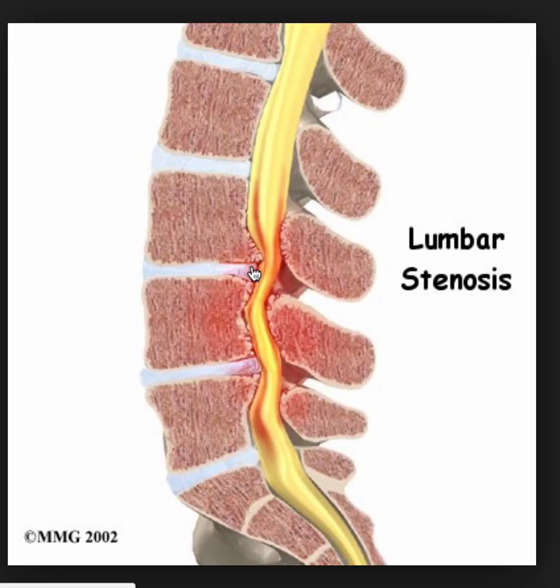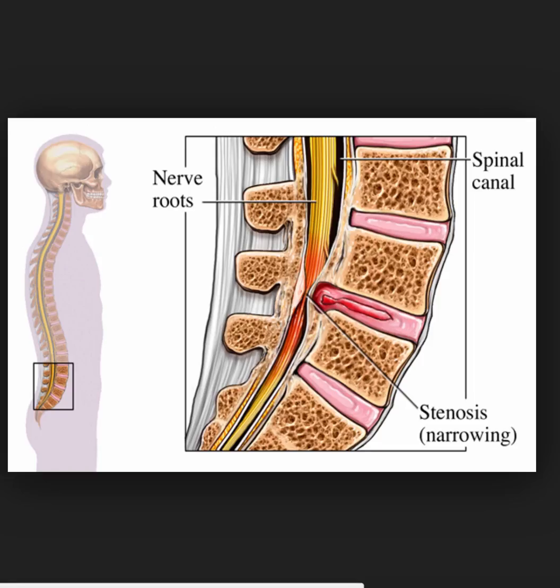And in fact, this is the most common presentation clinically and on radiographs here. L3-4 plus L4-5. All right, and because of that, we get two concurrent levels of compression on the spinal cord. You see that? And that's going to cause a shutting down of the vascularization of the spinal cord. On the other hand, if we look at this picture, yes, we do have stenosis.